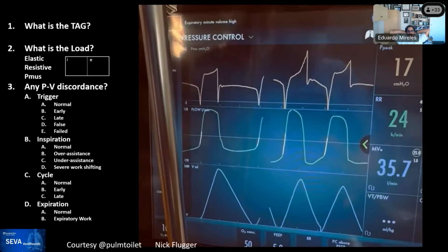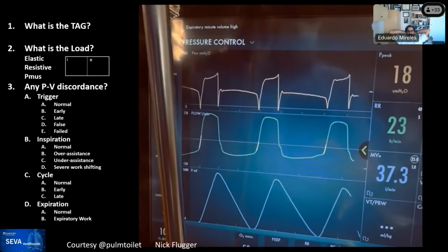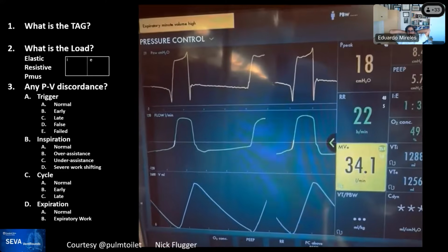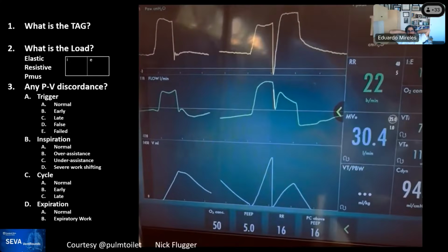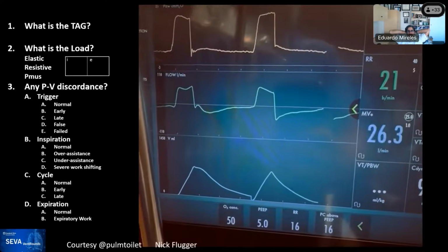It goes for an amount of time, then starts slowing down, with the inspiratory time from the patient becoming a little longer. The intensity goes down. There's an early trigger, another early trigger. It starts relaxing, and there goes into apnea.